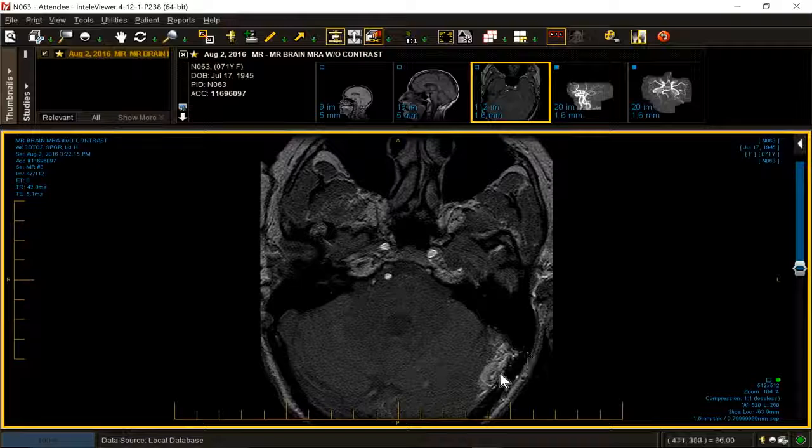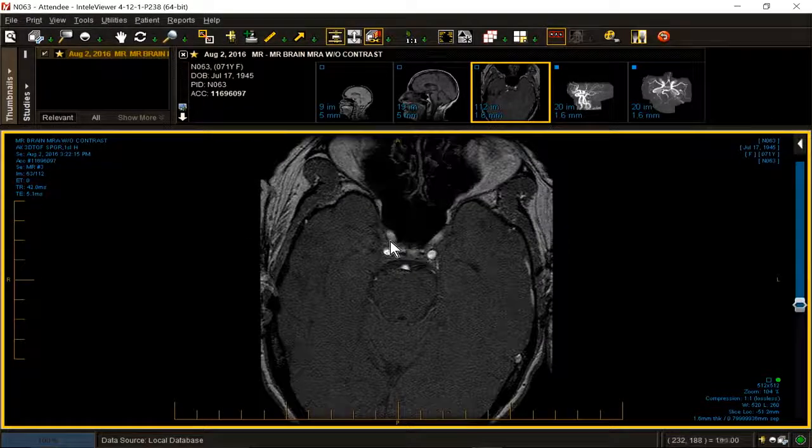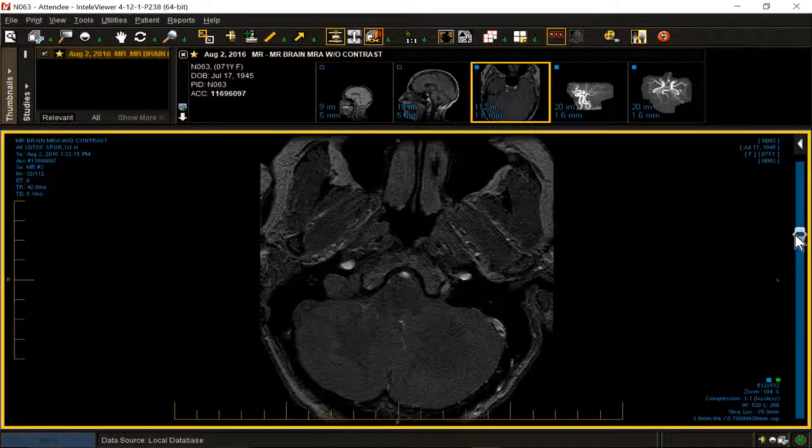We're in the brain right now, and unless you have the raw data of an MRA from a tip-off, either diagnostically or from a prior conventional MRI, you're going to miss it. This is where the diagnosis is made. So here are some features I would like you to focus on. First of all, where is the fistula? They're usually right here along the lateral sinus. Second most common location is going to be up near the cavernous sinus. And those can be acquired or they can be congenital. So they can be acquired from trauma.